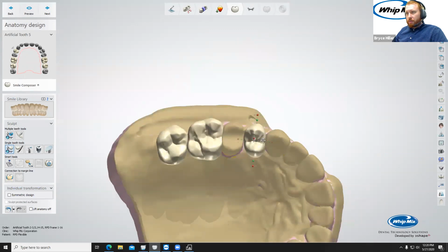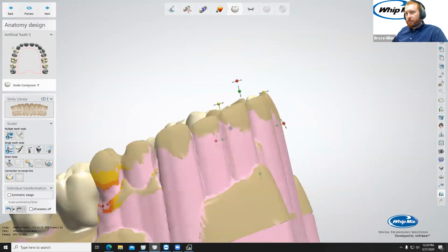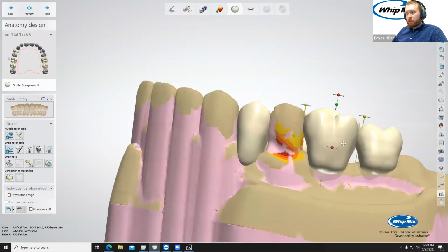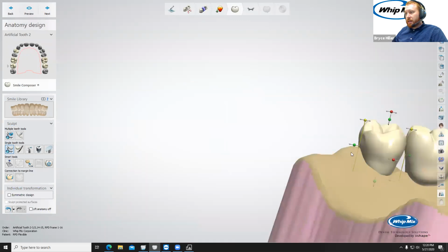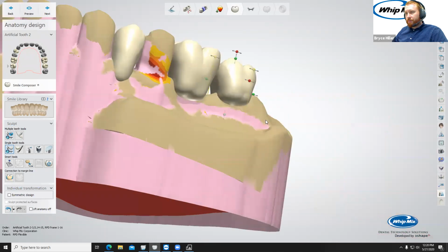I'm just going to start moving these into place. I'm going to do this quickly and not spend a ton of time.